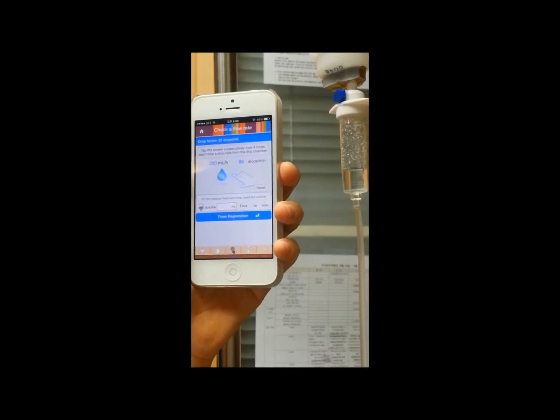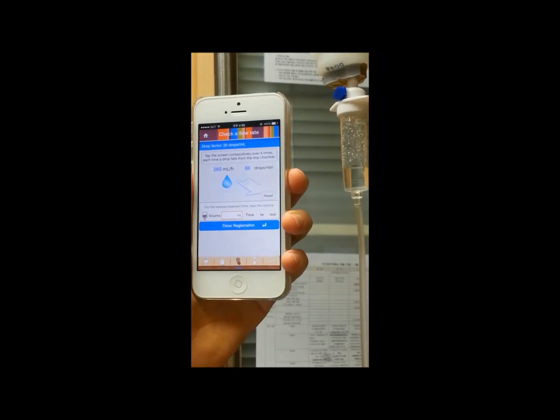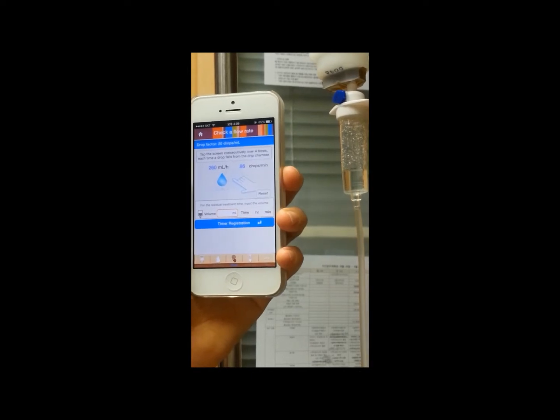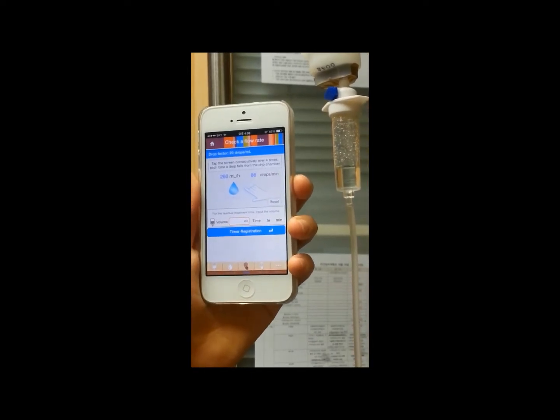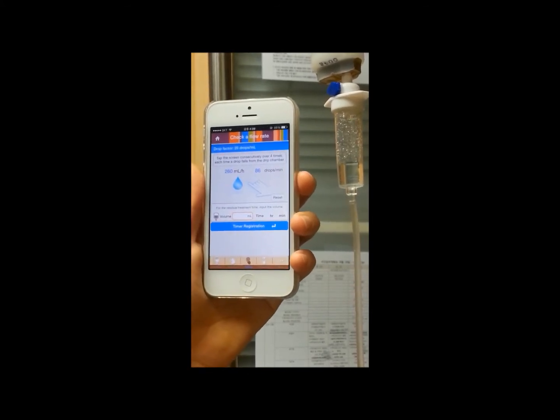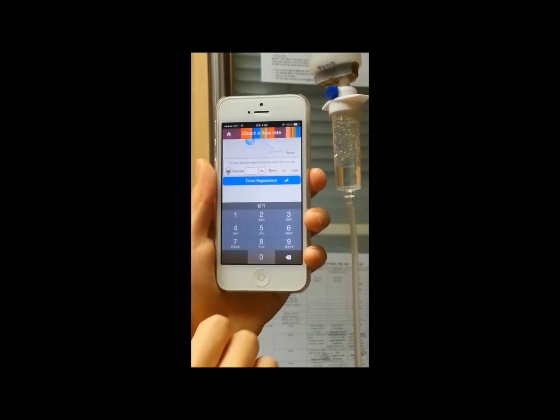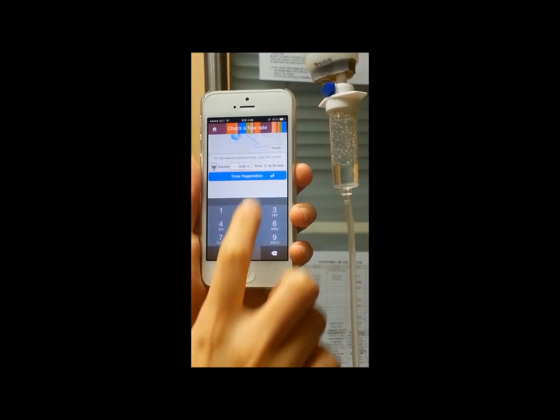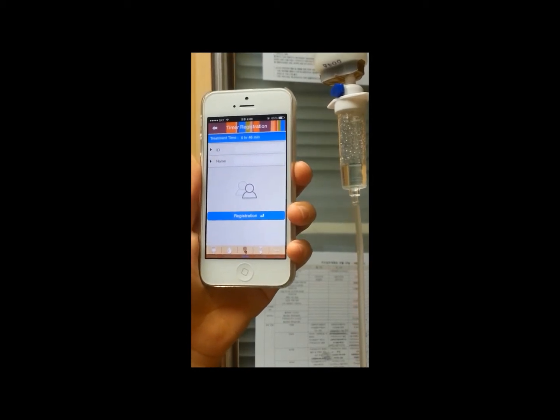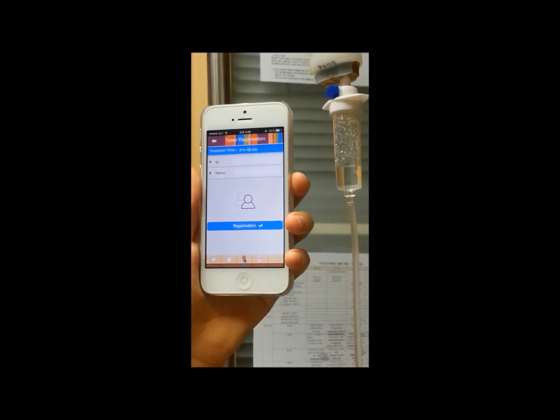Also, we have a timer function. The timer function shows the residual time. This function is interlinked with the setting and checking tool. So you input the residual fluid volume in the residual volume box. You are going to see an IDN name on the screen. There you can input an IDN name.